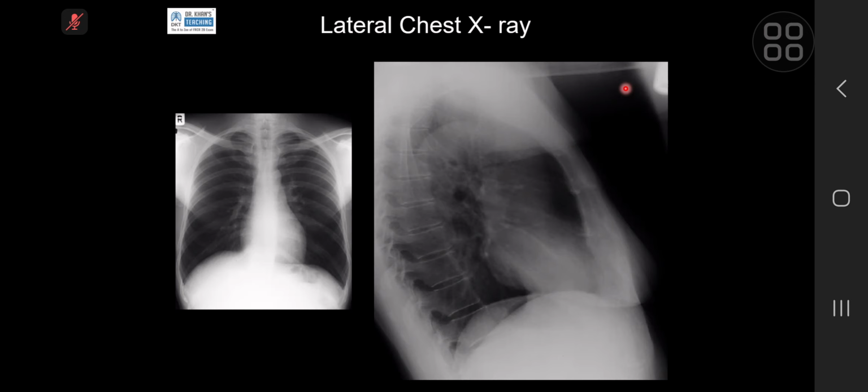The lateral chest X-ray is a good X-ray to characterize masses of the mediastinum location-wise. And this is what this case was about. I wanted to check your knowledge of the lateral chest X-ray because there are specific areas, and according to the areas, there is a specific differential diagnosis. I think the candidate did well where they pointed out esophageal or hiatus hernia. So that was the exercise.